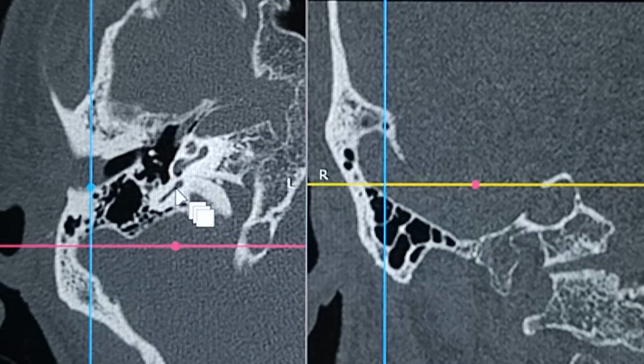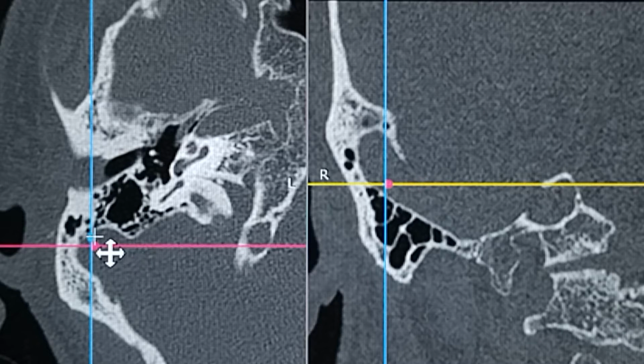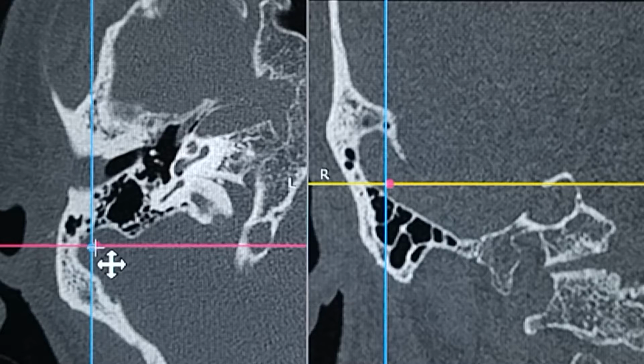So what you can do is draw a straight line from both ends of the posterior semicircular canal. You draw a straight line like this, make it pass through like a plane. So if the very prominent part of your sigmoid sinus is medial, this is medial and this is lateral, so if it is medial or posterior to that line, it becomes type 1.